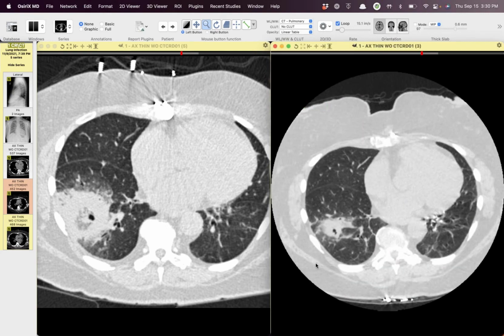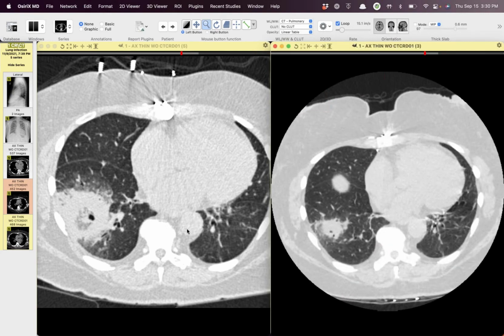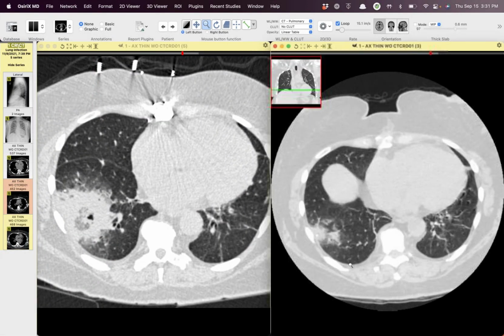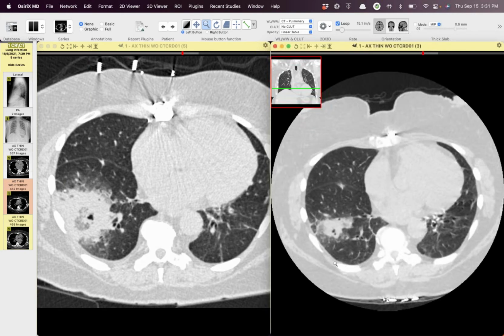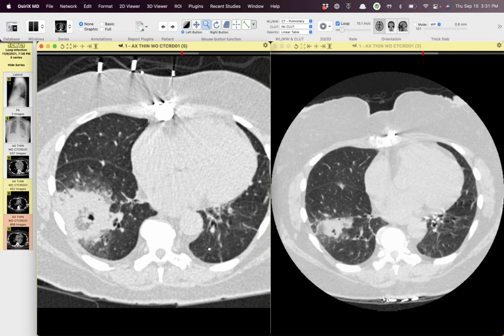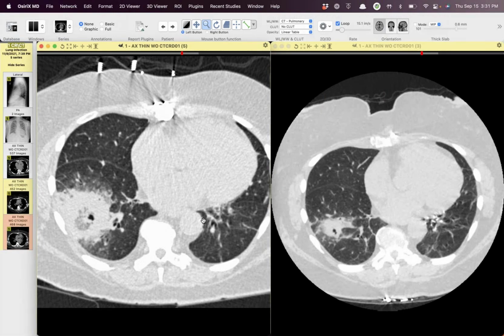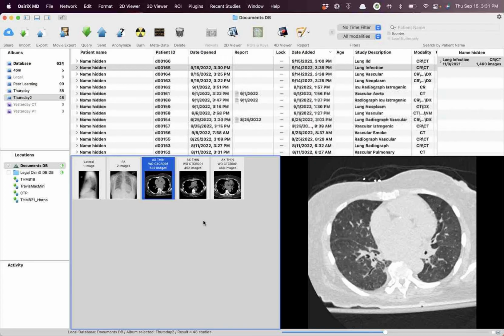Yeah, just typical evolution. I mean, it looks very similar to what we would see in a neutropenic patient. Right. So, the thing about mucor is it's often out against the edges of the lung like this. It likes the edge, sometimes it's way up at the top of the lung, but often near the axilla or in the base like this, near the external pleural surfaces. So it does that more often than aspergillus. Aspergillus seems to like the centers of lungs, and mucor often chooses the more peripheral lesions, sort of the embolic location, where you'd expect to see pulmonary embolism or septic emboli sort of thing.